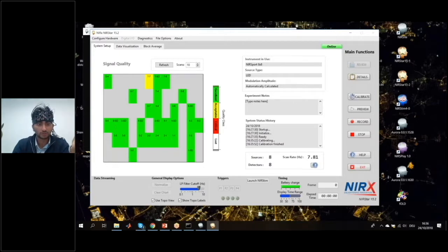And you can see here that we don't say source 1, short detector 1. We only say source 1, short detector. And this goes back to the time multiplexing concept, which was that the software already knows that when source 1 was activated here, this channel could only receive data from the short detector clip attached to source 1. So we don't need to specify which clip was attached to which source.